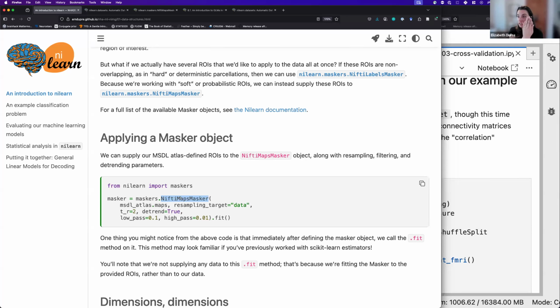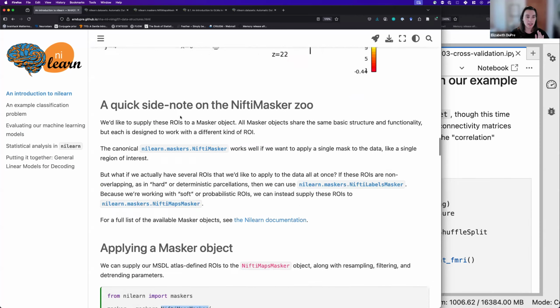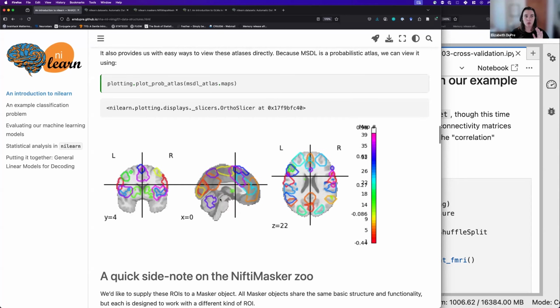And so checking that overlap between your atlas and your data is important. Here we're just plotting it on the MNI template, but we could also plot it on our functional data and look at that. I think that's hugely helpful for making a decision about which atlases to include. Because if an atlas doesn't have a lot of information in your regions of interest, or you don't have a particular parcel filled in, maybe given your particular scanning sequence, then that atlas isn't as useful to you.